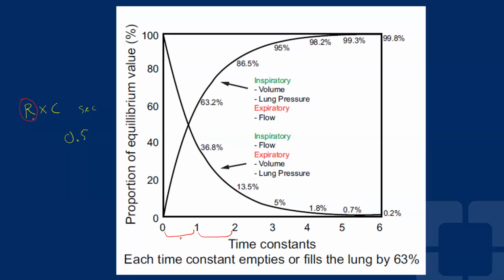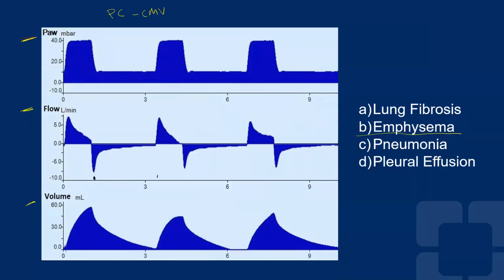However, you see a lot of these disturbances during the expiratory flow, and the question says, well, why are these? What are all these abnormalities on the expiratory flow? One, is this a sensor malfunction? Is this cardiac oscillations? Is this circuit condensation? Or is this because you set the scale so high that you can see all the aberrancies on the waveform?